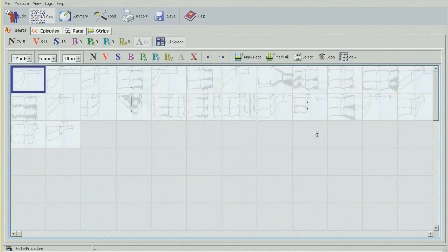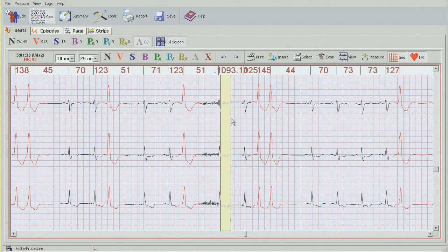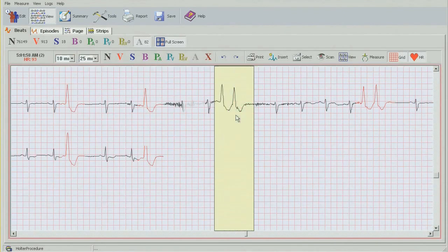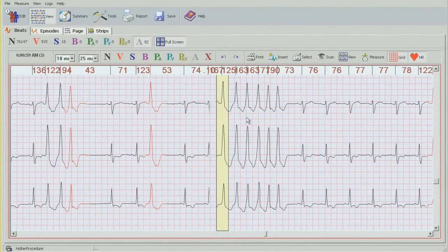And we do have some ventricular beats here. First, this one here, so I'm just going to double click, and there's a couplet which I'm going to change and go back to where I was. Next one here, another couplet, and there's a run, sure enough.